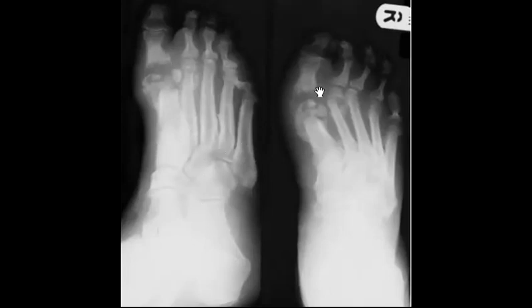So you will ask if any trauma happened to this patient. If there is no trauma, then Charcot will be the most probable. Search for any vascular calcification in the image. It will help you to determine that it is diabetic.